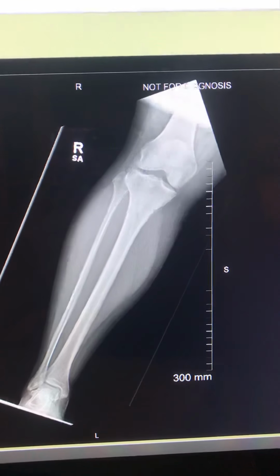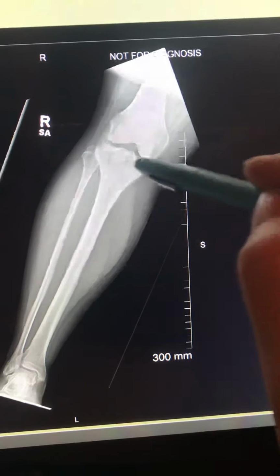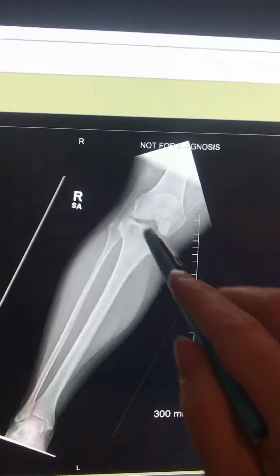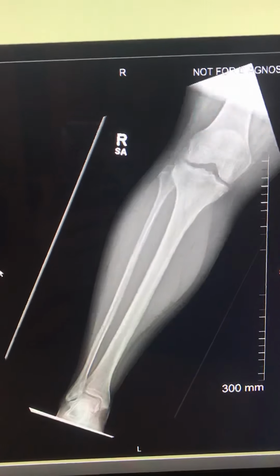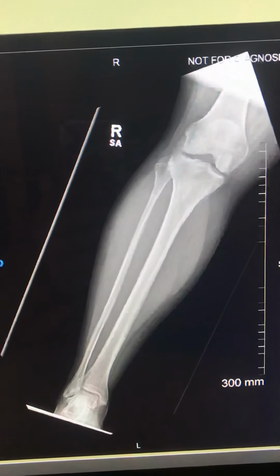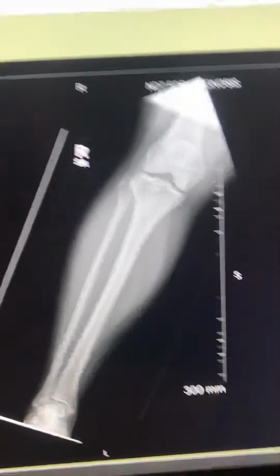The femoral and tibial condyles are in profile. These ones. This one's tibial condyles. The soft tissue margin is seen just to see if there's any pathology in the soft tissue because she was run over by a car. There's no rotation visible on the AP.